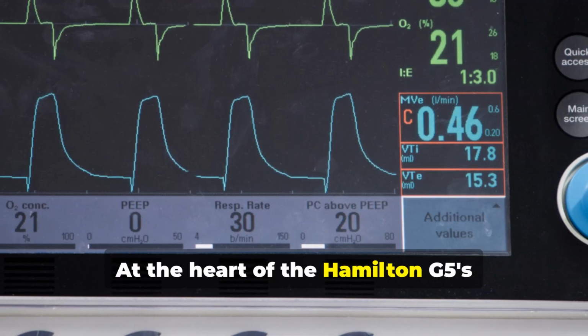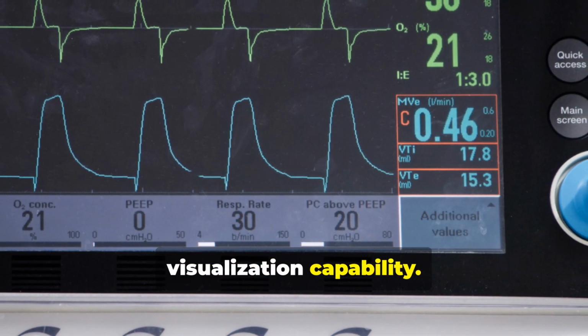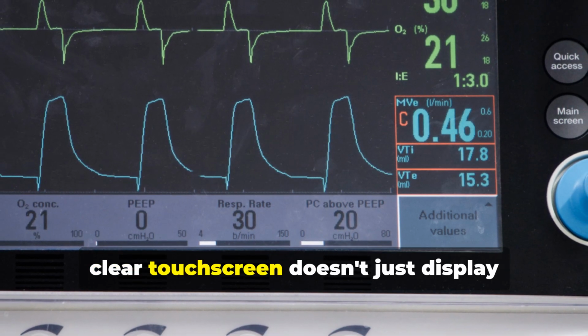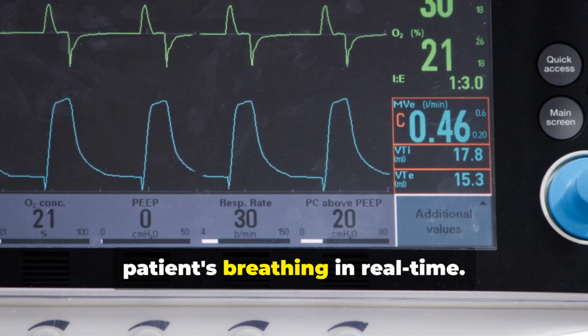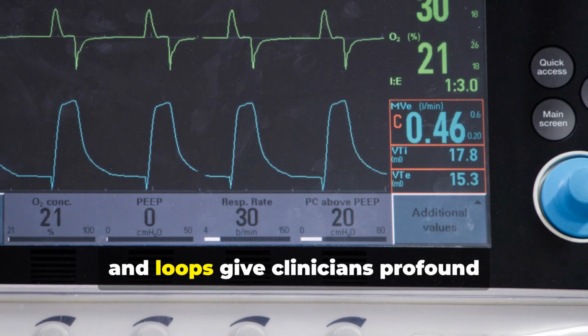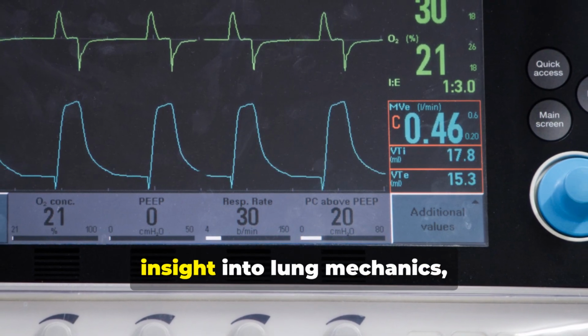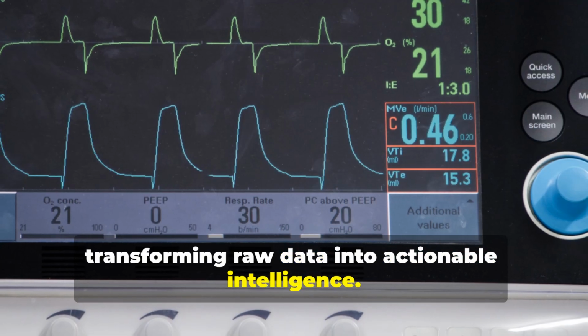At the heart of the Hamilton G5's clinical power is its advanced visualization capability. The large, clear touchscreen doesn't just display numbers, it tells a story about the patient's breathing in real time. Its integrated graphics, waveforms, and loops give clinicians profound insight into lung mechanics, transforming raw data into actionable intelligence.